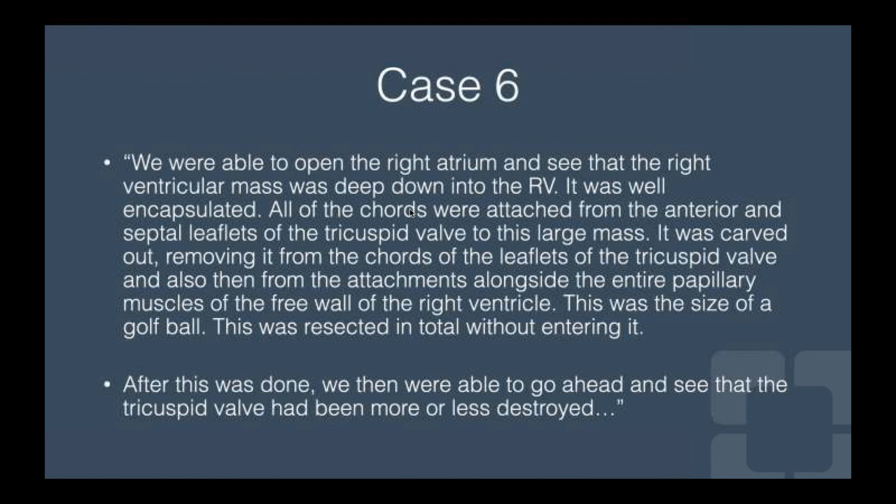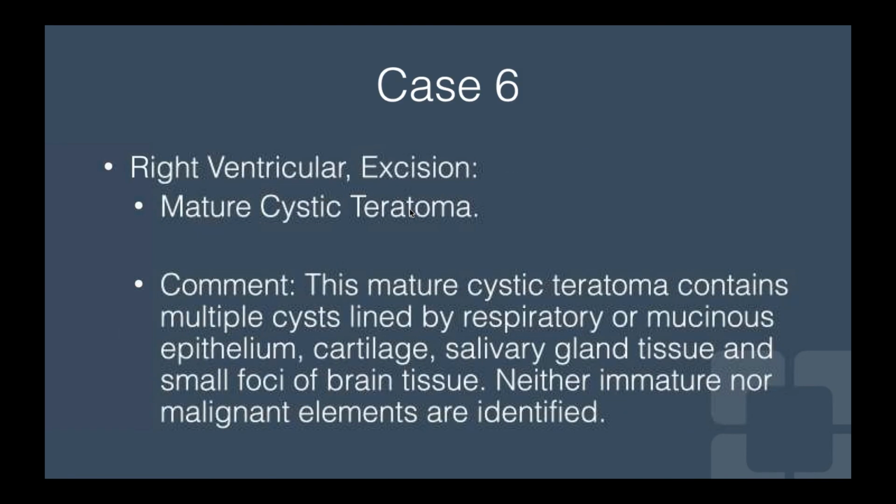So complex. I'm sorry, this is your PSIR. Again, the septations are the ones that are showing that enhancement to some degree, but there's areas that are cystic, like we had seen before. So no enhancement there. So we have a complex, multi-septated mass in the right ventricle, has areas that look like fat, areas that look like mucinous content.